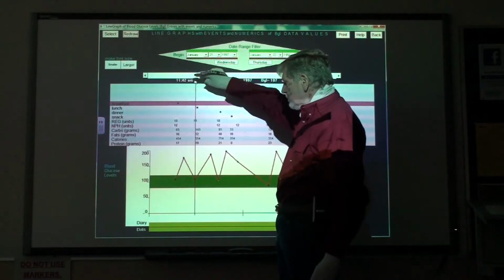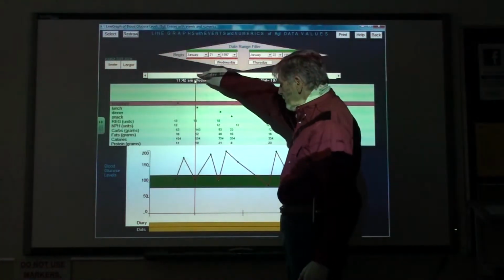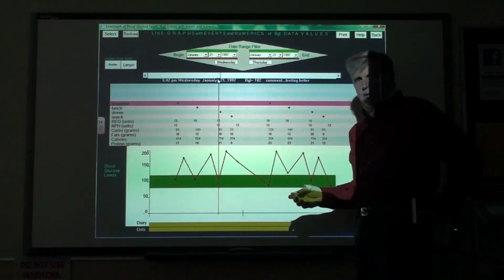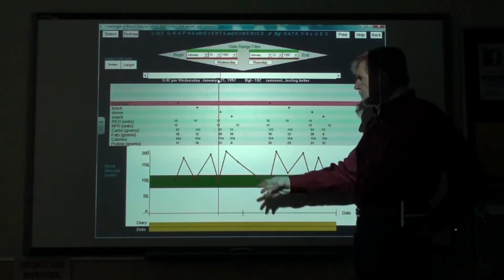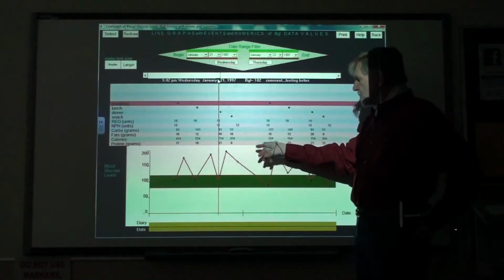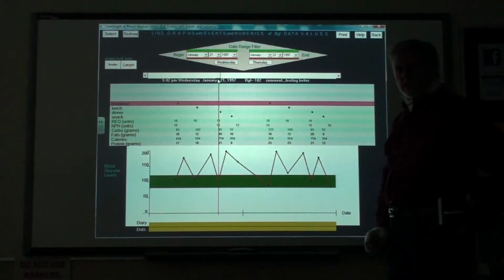and they eat some more food, and they inject some more regular, but their reading goes back up. So what's happening is every time they eat some food, their reading goes back up. It's the job of the short-term insulin to keep the reading down immediately after eating. The short-term insulin is insufficient in dosage, but after the meal wears off, the long-term insulin is taking the reading back down. So the conclusion from this graph is that the long-term insulin is doing its job.